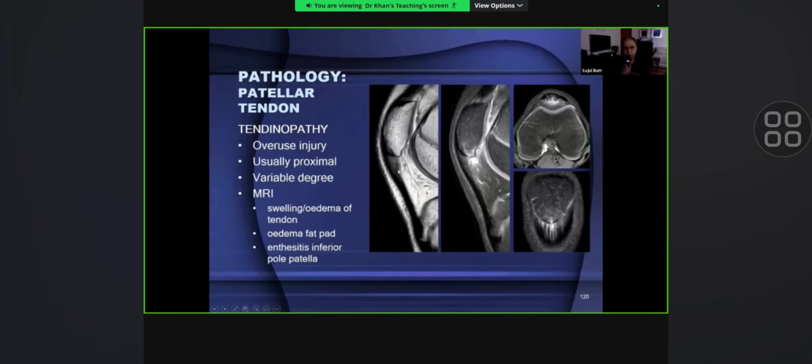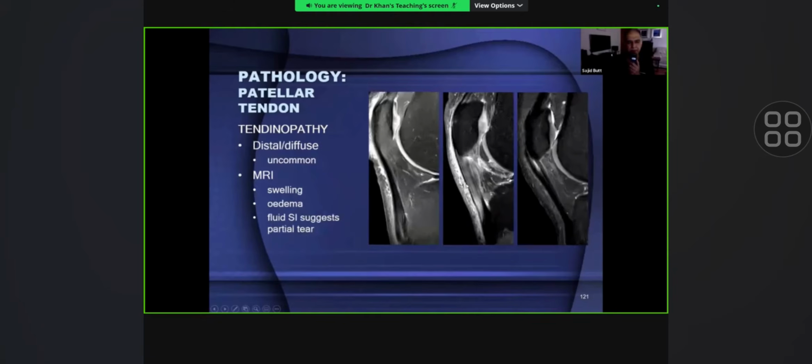Tendinopathy or overuse, I've seen that very commonly in patients like football players, and they get thickening of the ligamentum patelli. Notice that this thickening is much more than the magic angle artifact that I explained earlier. We've also got bone bruising and deep surface partial thickness tear. And these ligament injuries can respond favorably to injections of platelet-rich plasma.